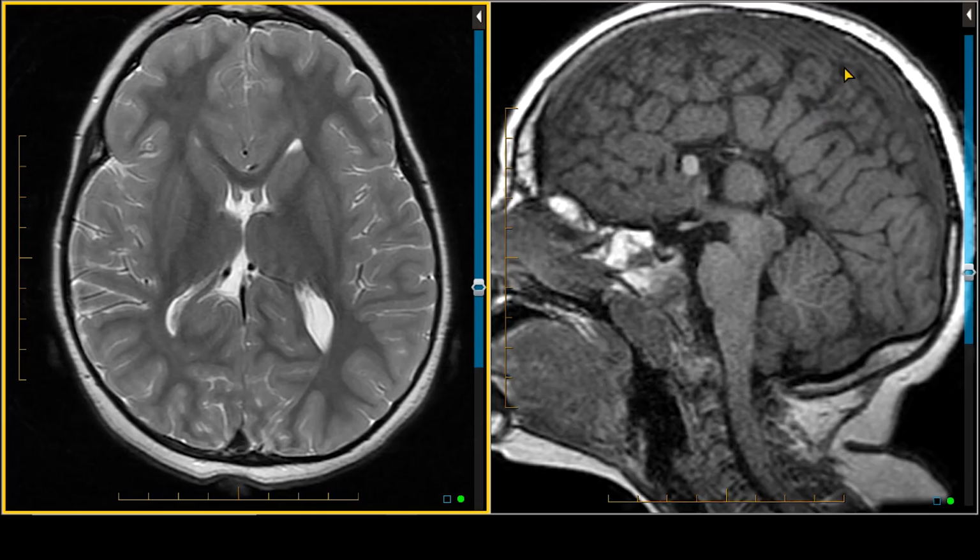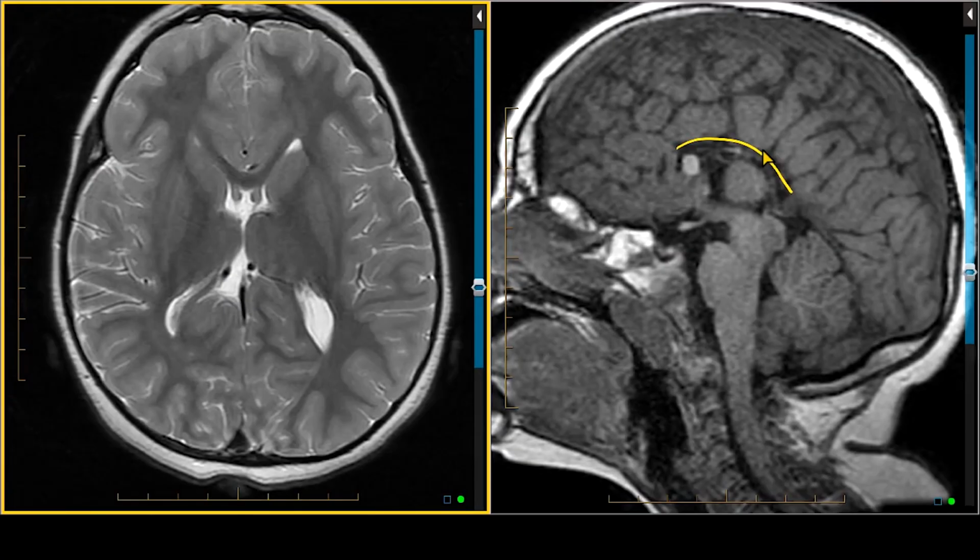Normally the perisagittal gyri of a cerebral hemisphere stop at the level of the cingulate gyrus, which goes anterior-posteriorly, whereas here we're not seeing it, and so we have these gyri that radiate all the way out. The corpus callosum would normally be here with the cingulate gyrus above it. Given that that's absent, this area here becomes relevant because we have these gyri that radiate all the way out from the third ventricle, whereas if there was a cingulate gyrus present, that would not be present.